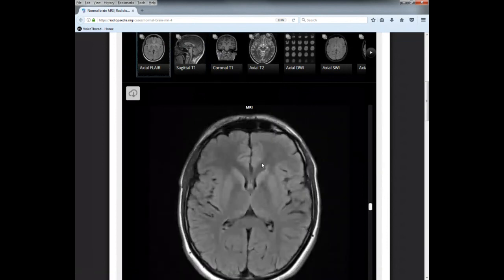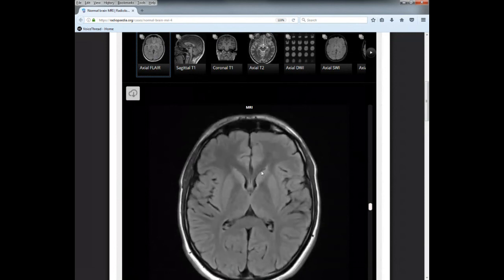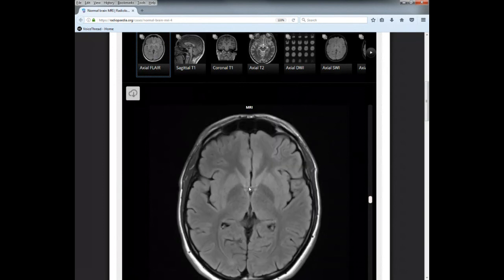You can also see it in an axial view. This is it right here, anterior commissure. Communication between right and left hemispheres. Okay. Genu, down, down, anterior commissure. All right, so that is your corpus callosum, the largest area of white matter deep within the cerebral cortex.